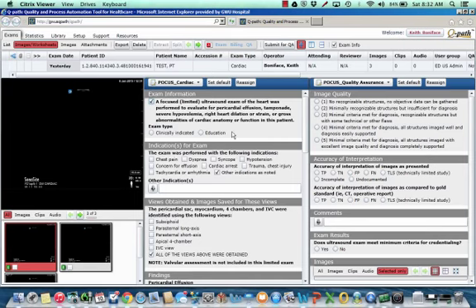Exam type is kind of important. This is kind of the differentiation that we've used in the past between putting things in the chart and not. If you're doing an ultrasound exam with a credentialed provider for the purposes of making medical decisions and not getting the same ultrasound exam down the hall, click clinically indicated. So fast exam in the trauma bay, clinically indicated. Looking for an abscess on the fast track, clinically indicated. Doing a right upper quadrant ultrasound and then sending the patient to radiology for a right upper quadrant ultrasound, education.